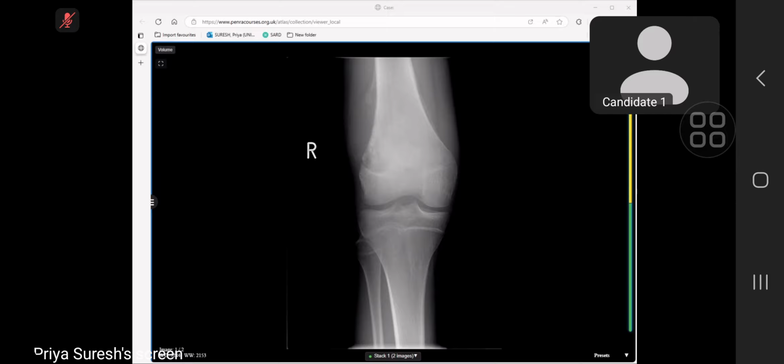There is an elevated periosteum which shows the Codman triangle, and there is cortical destruction along the lateral aspect, and there is an associated soft tissue component. No extension into the joint cavity in this place. No evidence of calcifications, and the rest of the joint cavities and bones appear normal. So it's an aggressive lesion. Keeping in with the patient's age and elevated periosteum, it's likely osteosarcoma.